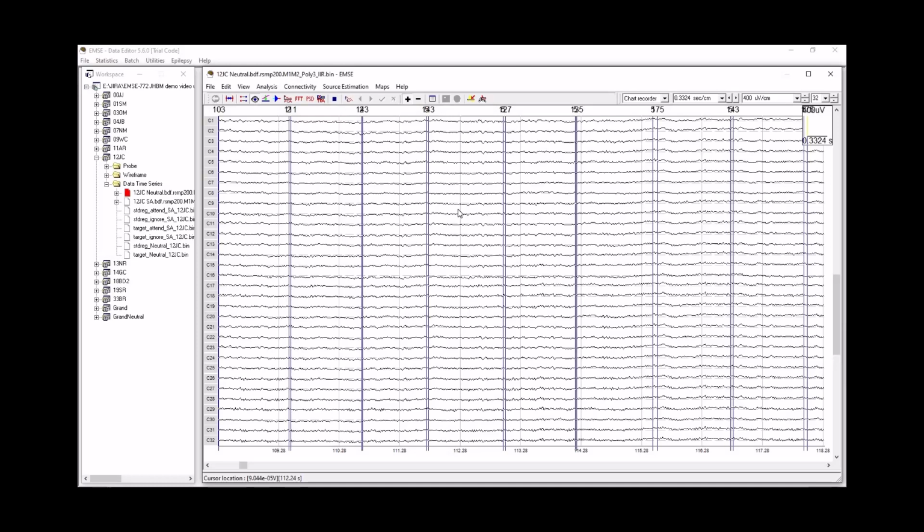Okay, after step 2, we didn't yet have these averages here. We only had these two. And we didn't have grand averages either. So how would we do these averages? Let me take just a little bit of time to show you how this is done.